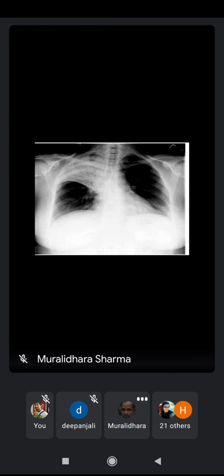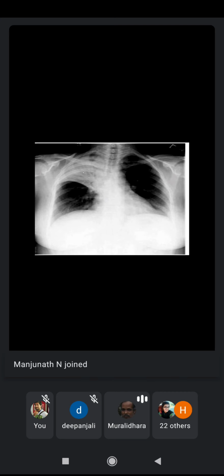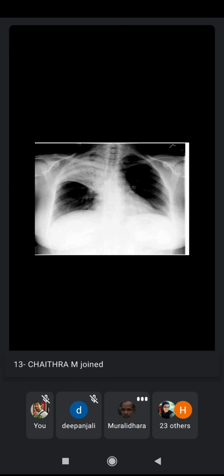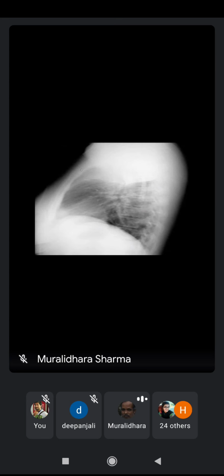Along with this, you can also see that the trachea is slightly deviated towards the same side as the lesion, particularly at the bronchial division. The right bronchus is more deviated towards the same side, and the intercostal space is also reduced at the superior area, suggestive of a reduction of lung volume. The reduction of lung volume and the shift of the trachea towards the same side confirm the fibrosis, and the cause could be some obstructive pathology.